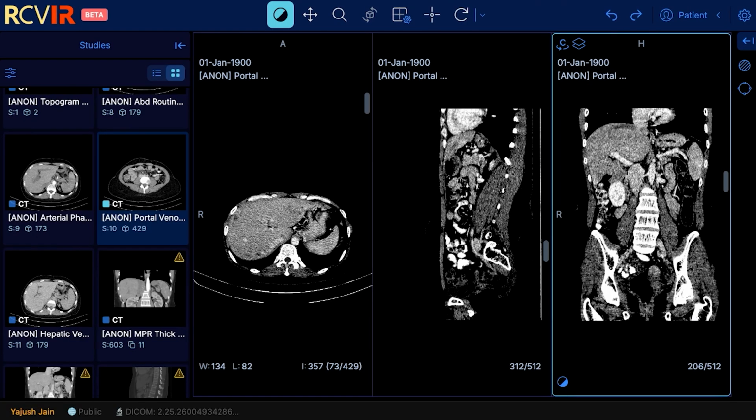So the important takeaway point is that post-transplant patients are highly prothrombotic. So always make sure that the hepatic veins are patent before we call it a veno-occlusive disease. If we are not able to see any sort of enhancement pattern in the vein, then we will definitely go for a Budd-Chiari syndrome rather than a veno-occlusive disease.